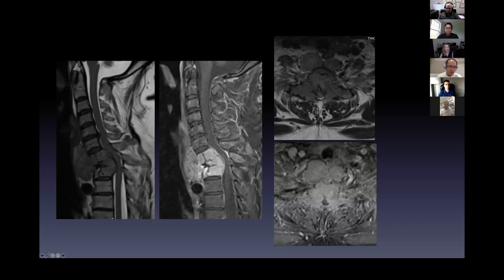Then we talk about the alignment. So when we're talking about spinal stability, does this person need to go to surgery? Do they have still preserved alignment? Do they have frank subluxation or translation, which means they're very unstable? Do they have a new kyphosis, which this almost looks like? So we would put that in our report as well.